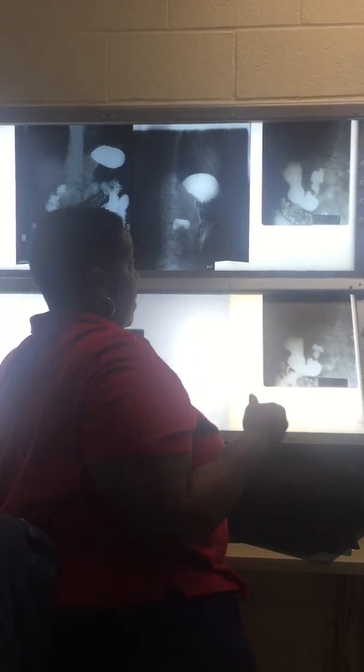And that pretty much covers your upper GI. Like I said, you have the AP and PA, AP oblique and PA oblique. We did go through lateral, but I'm not sure if I put a lateral on the test. The key thing to remember with the lateral upper GI or lateral stomach is that you're looking at the space behind the stomach, in front of the spine, the retrogastric space. That's the key thing to remember with the lateral projection.